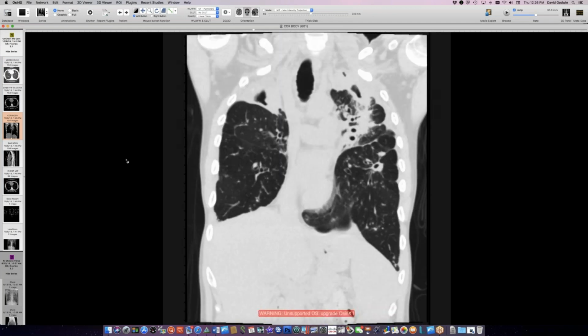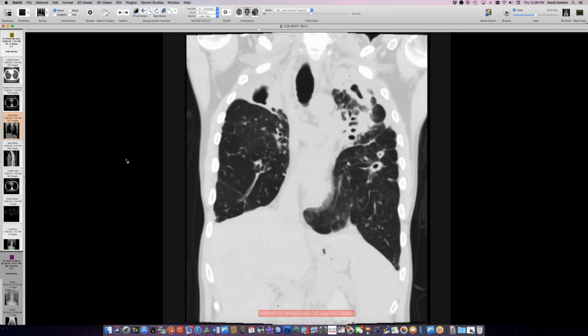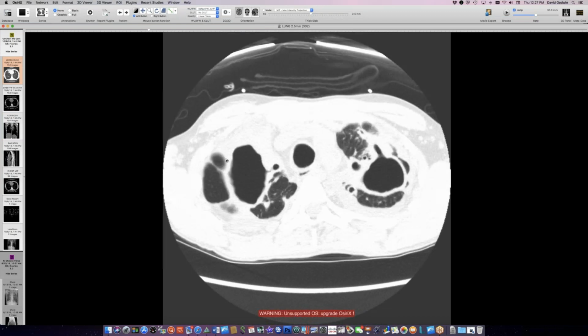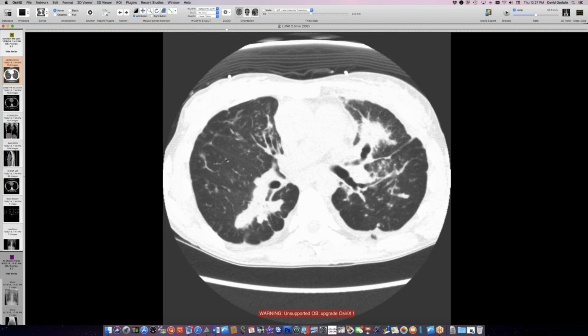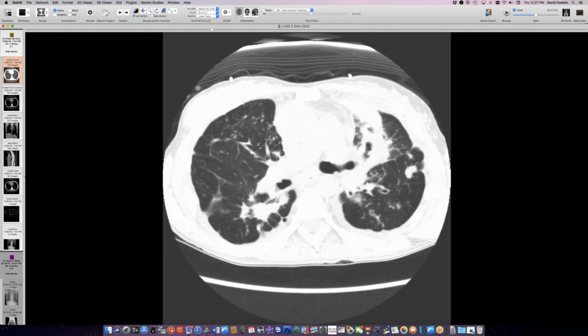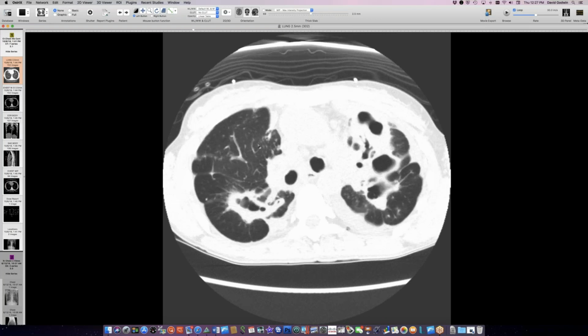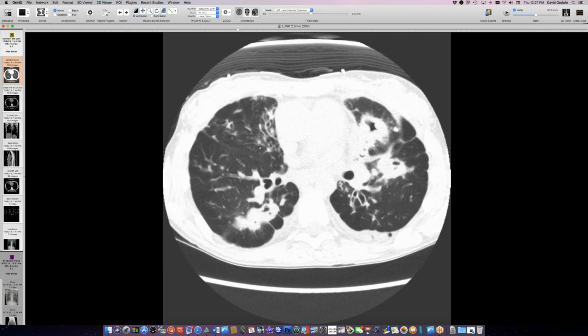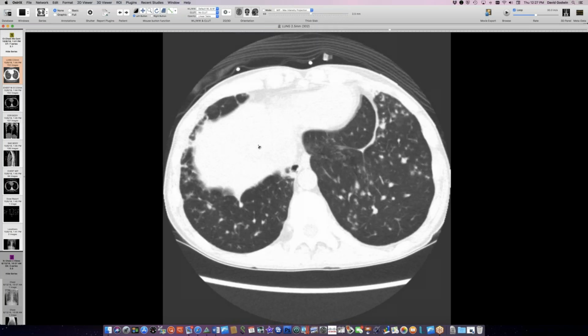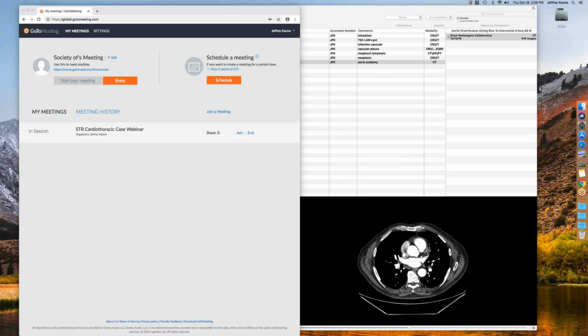So this is M. abscessus causing this cavitary lung disease. David, I know here at our institution, if they have M. abscessus, they won't list them for transplant. Right. That's true. And so that's the situation here too. I don't think this person's a transplant candidate because of this. So look at the bronchial disease here. It's fairly modest. This person just doesn't have the typical widespread bronchial disease of the typical cystic fibrosis mutation. M. abscessus with cavitation. And I think those are the 3 cases I have so far.